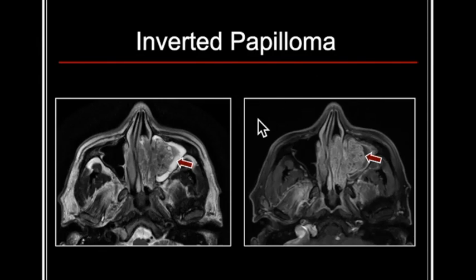MRI. And here we can see a more classic sort of MRI appearance of the same, with a cerebriform appearance, that sort of undulating, heterogeneous appearance, and then peripherally the trapped secretions. And again, on post-contrast imaging, it also has that same cerebriform appearance.